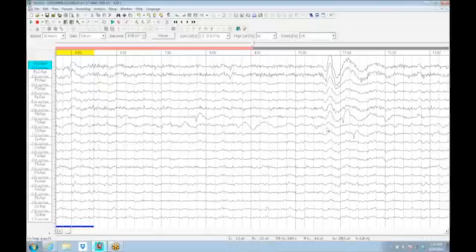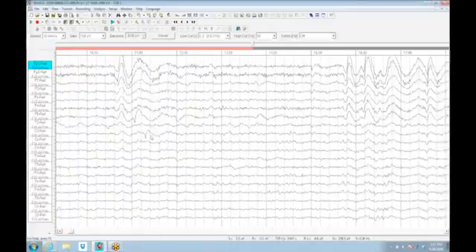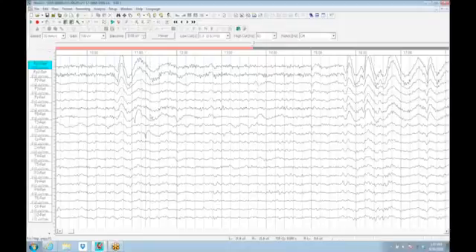You can see the slight electrode irregularity at T3. You can also see the electrode pop at F8, another small electrode pop, which again repeats itself here, and a small electrode pop at C3. And that C3 electrode is again a small electrode issue. You can tell it's a single electrode because at that point in time, there's no field. There's no similar waveform or content in any other location. It's just at C3. And that cannot happen from inside an intact skull.